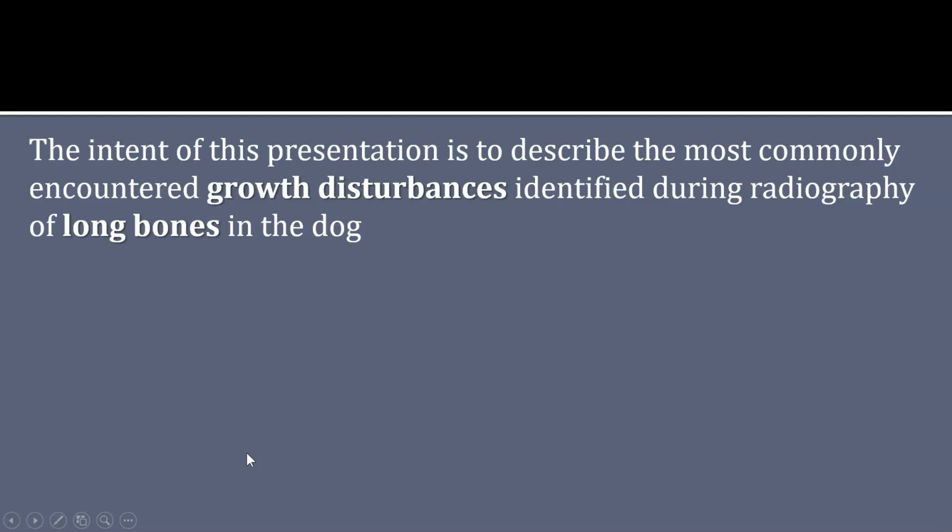The intent of this presentation is to describe the most commonly encountered growth disturbances identified during radiography of long bones in the dog. There are many growth disorders that you may have the chance to encounter, and we will not have time to discuss them.